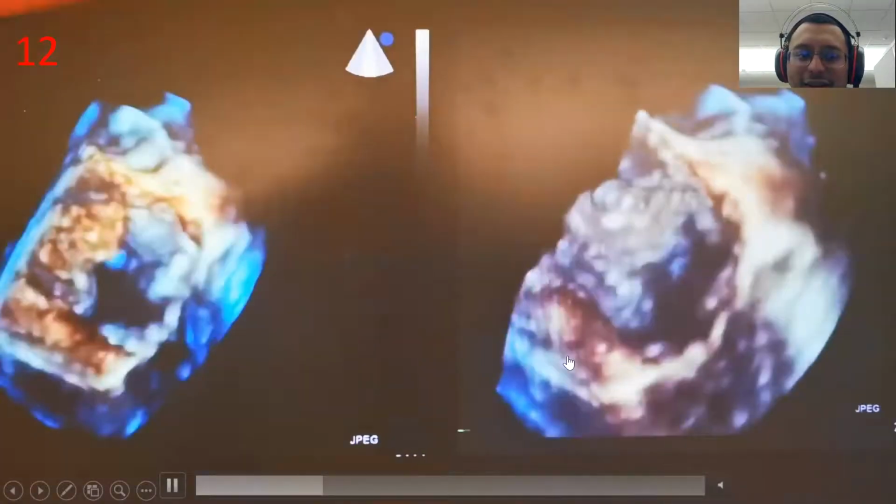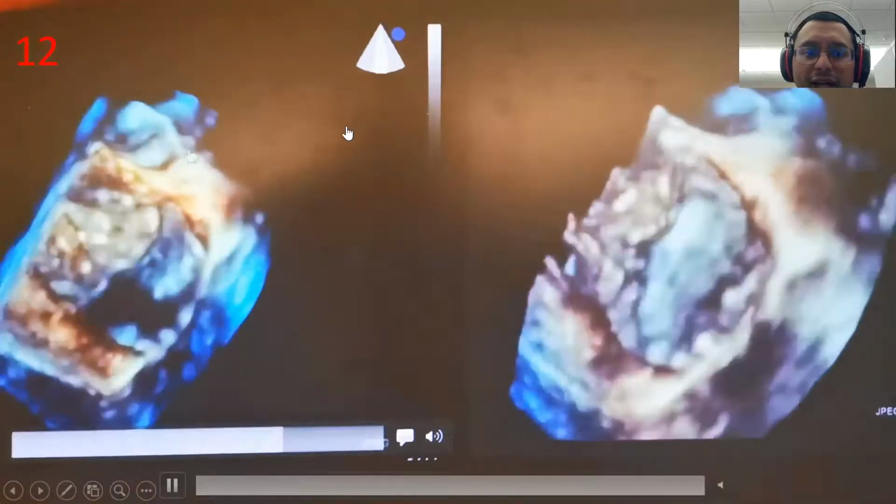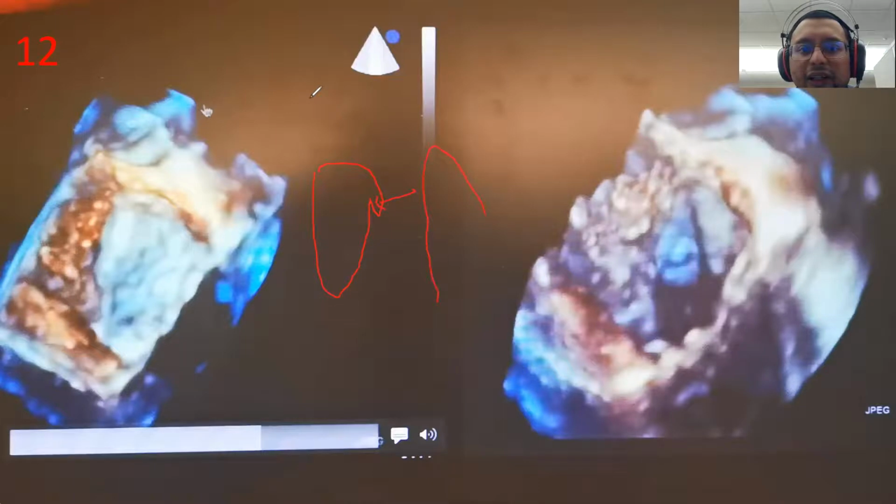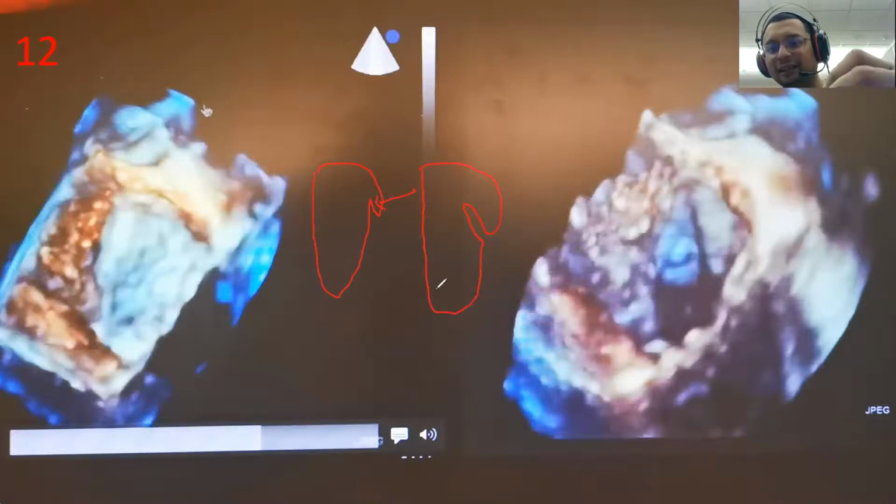So this is an amazing case. You know, right? So let's say this is your heart, then you will have a left atrial appendage coming out like that. For some reason, when the surgeon does the operation, the left atrial appendage gets inverted. It's like your cloth, and then you turn it inside out. The LA appendage is pulled inside the left atrium, like your socks, right? You pull it inside the left atrium.